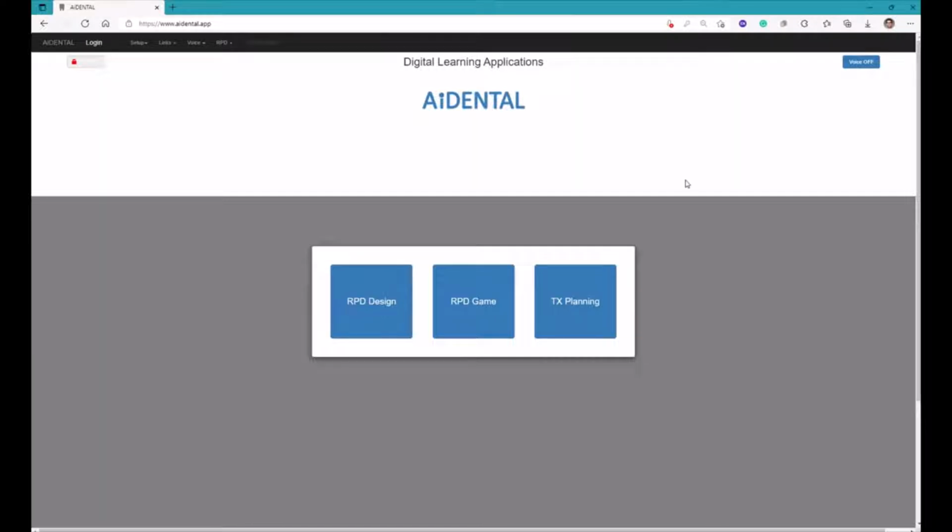Hello everyone, this is a tutorial for using the AiDental RPD Designer and game.